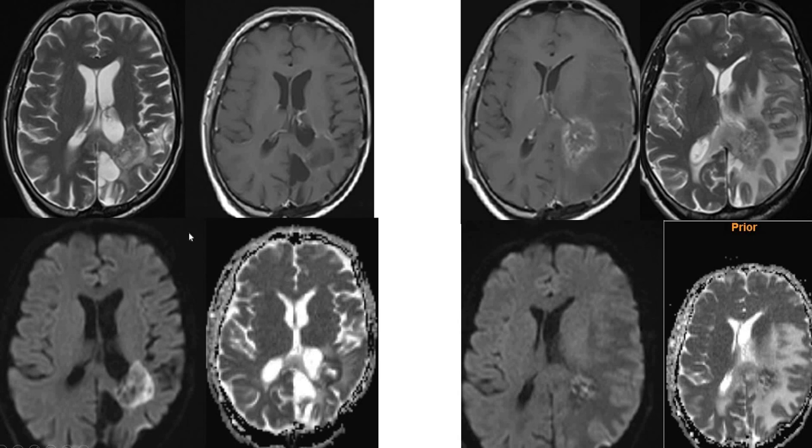This is the baseline, and this is the current study. After treatment, the enhanced component is regressed. The solid component on T2 weighted image is regressed.